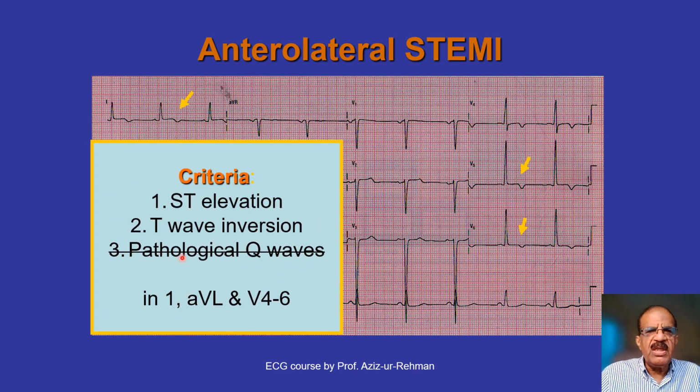So these are the changes: ST segment elevation, T wave inversion, but no pathological Q wave as yet, because this is acute. And which leads? Lead 1, aVL, and then V4 to V6. So these are the diagnostic criteria of lateral wall infarction.